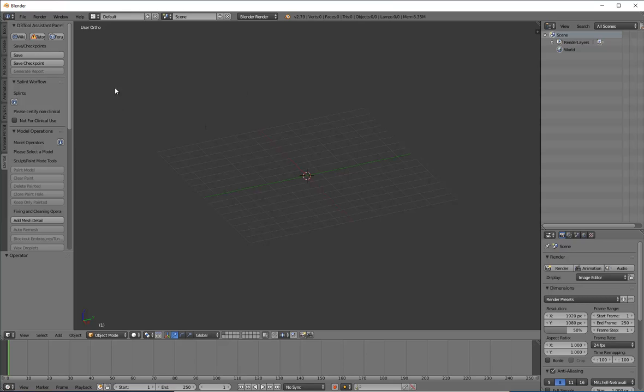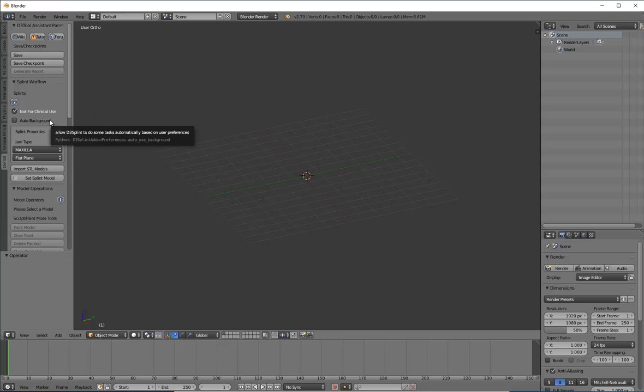Once you are ready to get started, you open up this software. The first thing we're going to do is click on not for clinical use. That's basically you saying that I'm going to design something, but I'm the one taking responsibility for any guard I design. It's the same thing you do when you use an articulator in your lab and you suck down and make your own night guard. This is just saying that the software itself isn't accepting liability. You are confirming it's going to work.